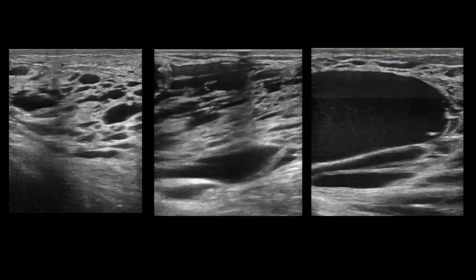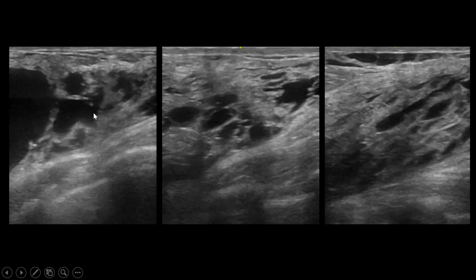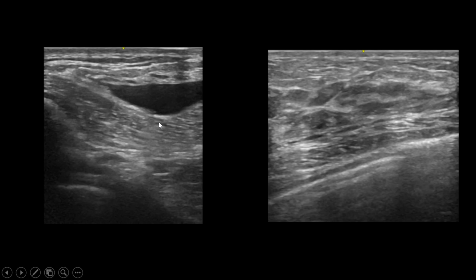Ultrasound of the left breast was performed using the linear probe, which revealed that the left breast was diffusely enlarged with multiple discrete, confluent, anechoic, multiseptated cystic spaces involving all the quadrants of the left breast. There was no evidence of any internal vascularity within these cystic spaces, and no evidence of ductal extension or solid components. There was also a very minimal amount of normal breast parenchyma interspersed between the cystic spaces. These cystic spaces were also seen extending up to the axilla.